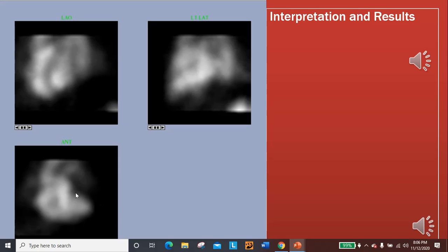Normally, if you were pulling this up in the processing, it would be a cine image, so it would be moving and you would be able to see the ventricles contracting and filling, although we were having troubles getting that information as a cine, so I just have the pictures for it, but you can imagine. You would be reviewing these cine images in order to look for any wall motion abnormalities or anything like that that you could report. So these are the 3.